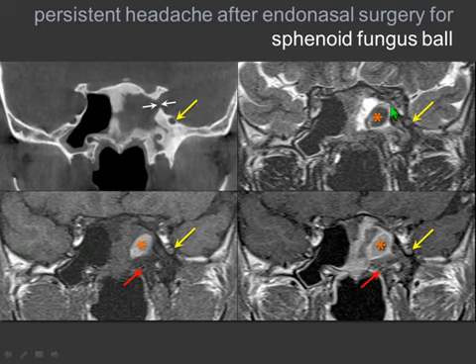And still we have accumulation of fluid, but not a fungus ball. This is hypo on T2, but it is hyper on T1. Therefore, it is not a fungus ball. And where on the Cone Beam CT you don't see any bone, you see that the bone is still there looking at MRI, because even if you don't see the mineral content because of the resorption, you see the periosteal lining.